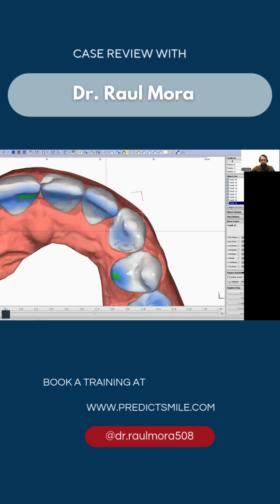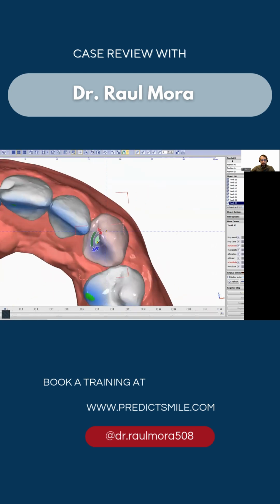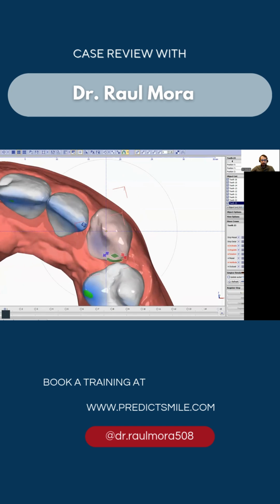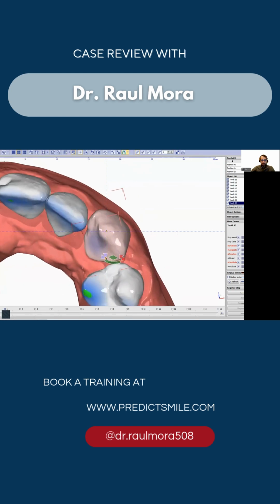So it's a mesial in movement. So let's do the distal out first. Distal out will be here. So let's make around 8 degrees. Or we can make it mesial in as well, but let's make some distal out initially, and then also we push too much forward. Maybe it needs a little bit.